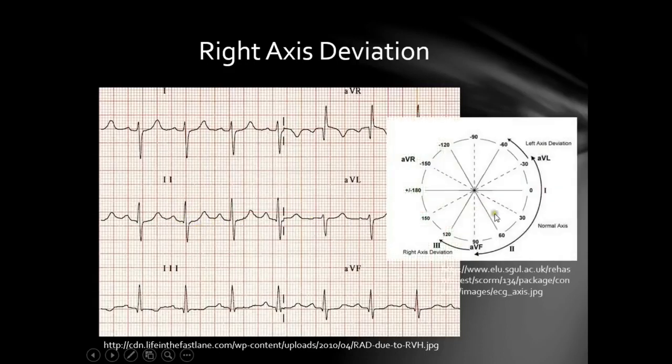So using the Cabrera system, we go to lead 2 and draw a perpendicular line to lead 2. So your cardiac axis is either pointing to minus 30 degrees or to positive 150 degrees. So looking again at the other leads, we can determine in which direction your cardiac axis is. We can see that lead 1 is negative and AVL is negative, so it has to be pointing away from AVL and 1. So your cardiac axis must be at exactly positive 150 degrees. And you can confirm that by seeing that leads 3, AVF, and AVR are positive, so your cardiac axis is towards AVF, 3, and AVR. And this is exactly the opposite of a left axis deviation finding, if you can notice.